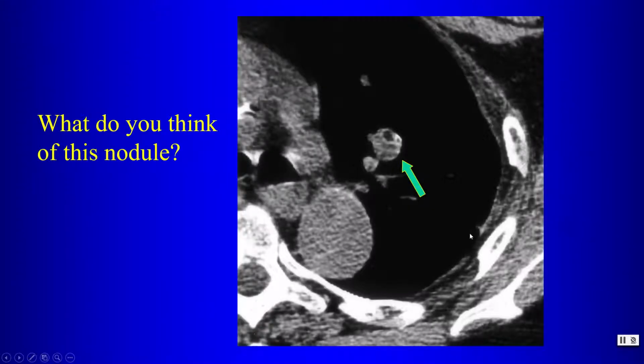So here we have another nodule. What do we think this nodule is? I'll give you a second to think about that.